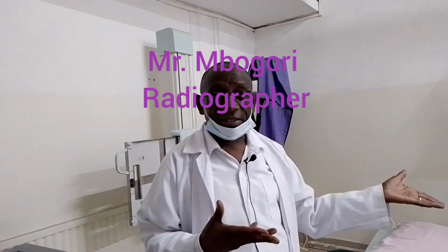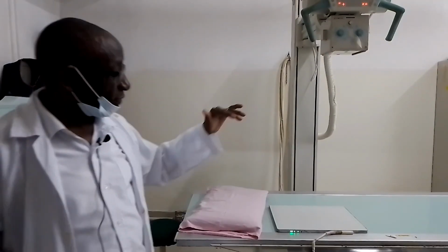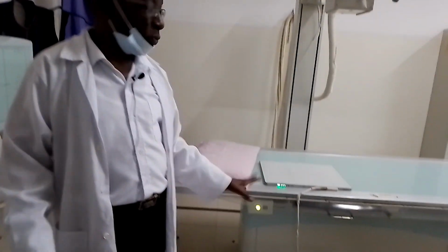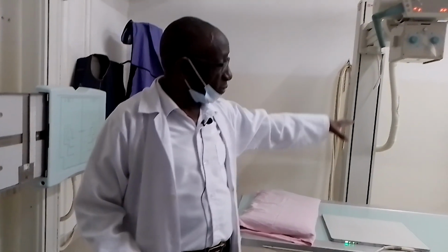I'm a radiographer. I work in X-ray machines. This one is a general X-ray unit, but you have to turn it to a DR system. With this plate, you can take all the examinations you need, and then this plate will be sending directly to the computer, so that from positioning here, from doing the exposure, then you can go inside here. You find that everything has come to this unit here.